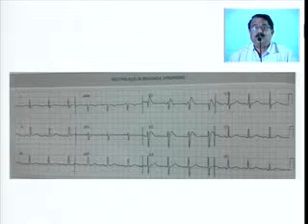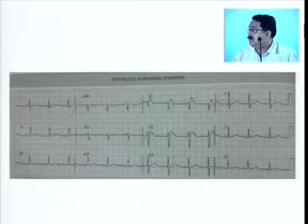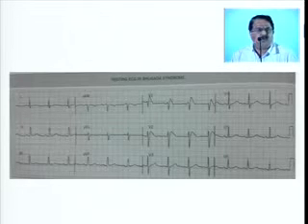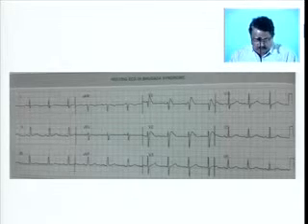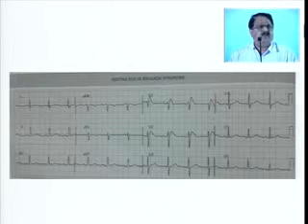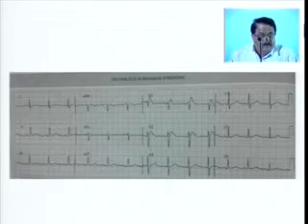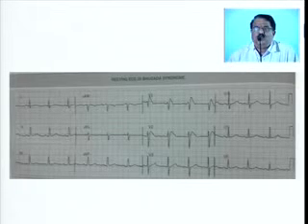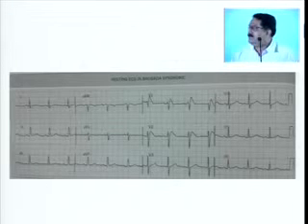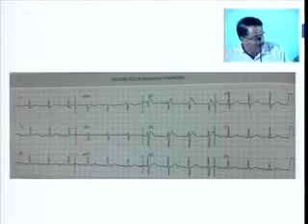Immediate DC shock was given, ventricular fibrillation was diagnosed, cardiac monitoring done, and instantly improved. A person has a normal heart clinically, normal echo, documented ventricular fibrillation in the ICU, preceded by a syncope. What is the diagnosis? This RBB is not a simple RBB. You watch that.